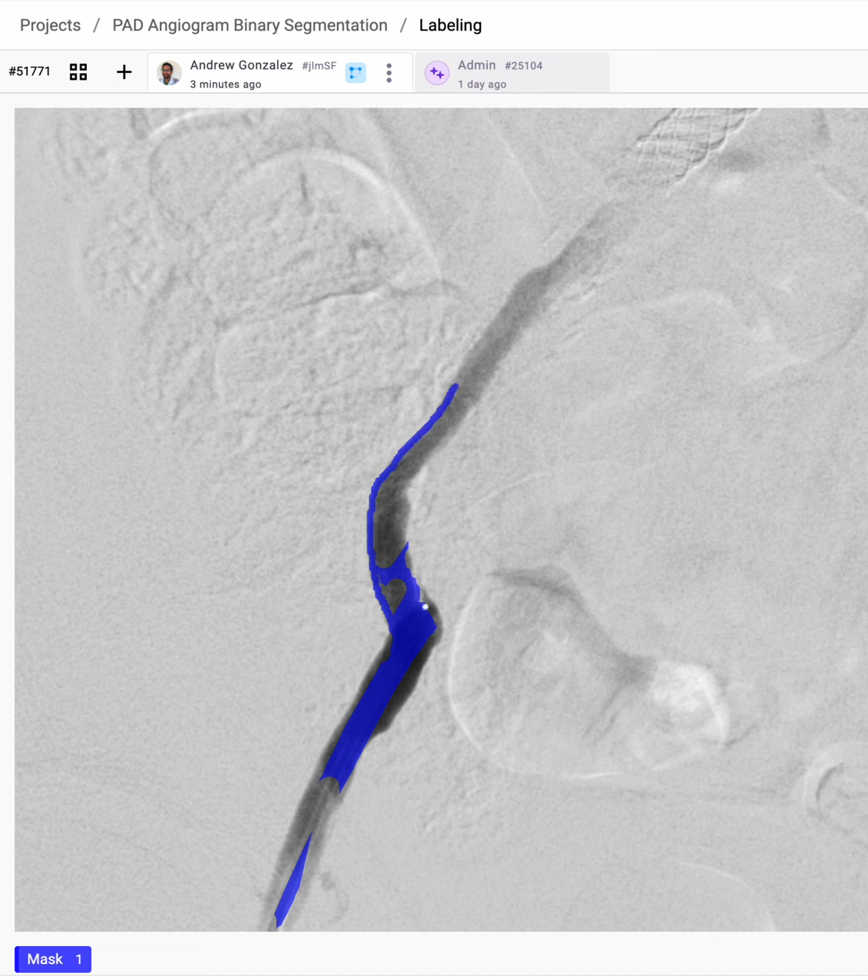There we go. So when we get up to the stent, the contrast doesn't actually make it into the stent. So I'm not going to fully label the stent. Instead, I'm going to label it to sort of where I can see. So I'm going to just sketch that out now, like that, to the stent edge wall. And then here I'm going to label to there.